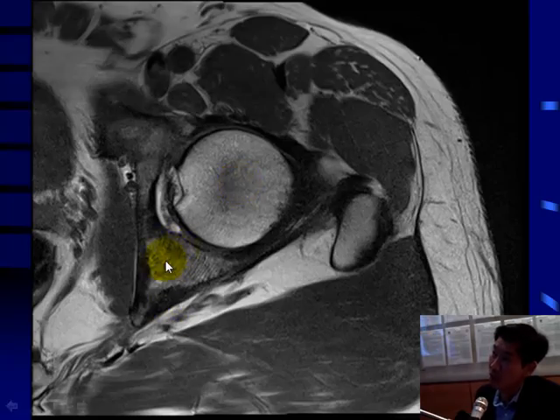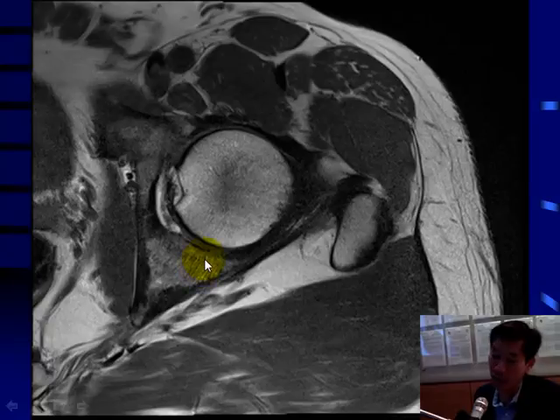And here in the left acetabulum, you can see the area of interspersed normal yellow marrow between the thickened coarsened trabecular. So there's patchy disease throughout this ischium and ilium. And also notice how the cortex is thickened. This is cortical thickening on MR. We don't like to look at bony structures on MR very much, cortex, but this is what it will look like. We prefer X-ray or CT.